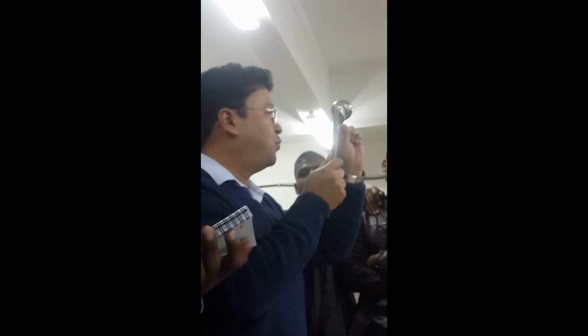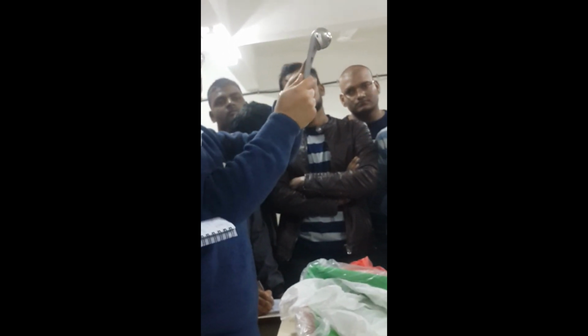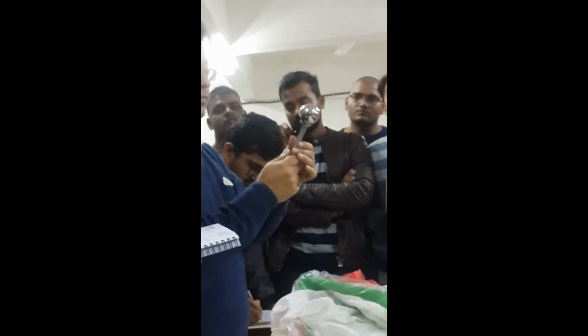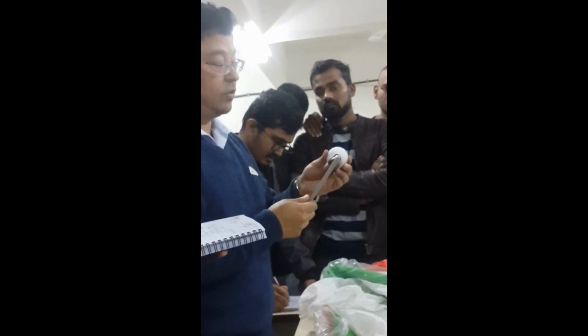You need at least 2 cm of bone stock above the lesser trochanter to put this, so that it can rest there. If it is not there, you have to use a Thompson cemented prosthesis. Mostly we use Austin Moore because it's easy. But if the stock of bone is not there above the lesser trochanter, then you have to go for Thompson. In Thompson there will be no holes, and it will have a short stem, but the neck will be a little bit larger. So if you get this, you will also be asked about the blood supply. Thompson, Austin. Okay.